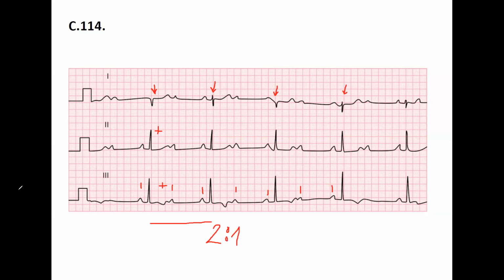Why is there no Q and S wave? Is that because of that? No, no. Here, this is unconducted. This P is not conducted. So relatively, the AV is blocked completely here, but the next revolution goes through. Here is not conducted. Here is conducted. Not conducted. Conducted. This is 2 to 1 AV block. Okay, this is how the 2 to 1 AV block works.